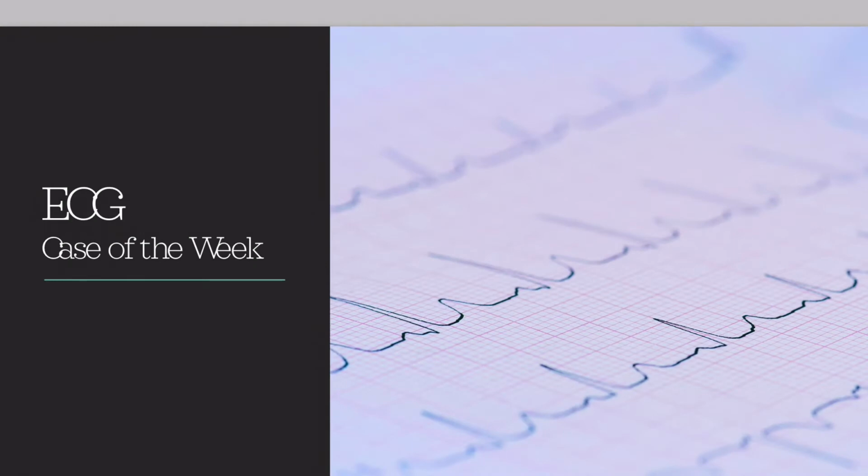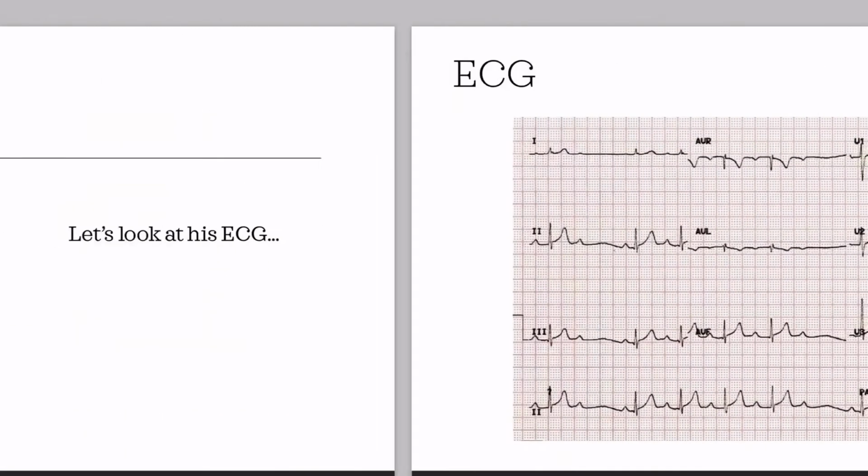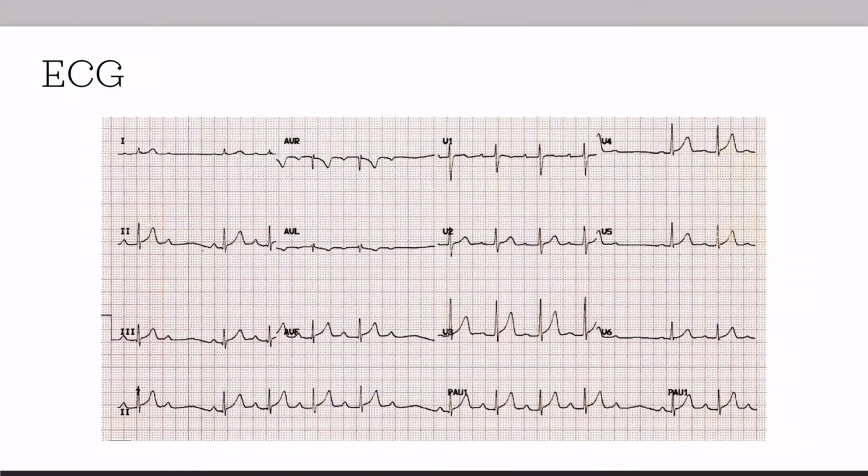Take a second here to pause the video and remind yourself of this week's clinical vignette. Perfect. All right, so let's take a look at this ECG. So we're going to follow our 6-step method to interpretation, and we're going to start here with our rhythm.